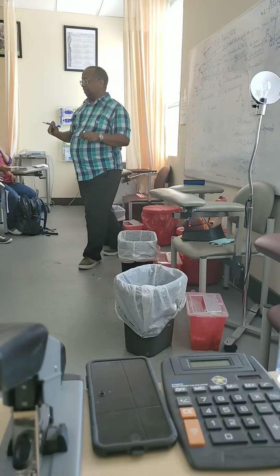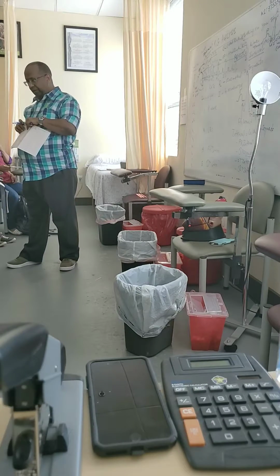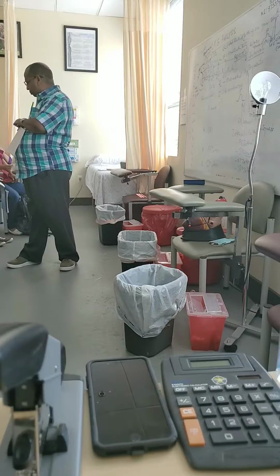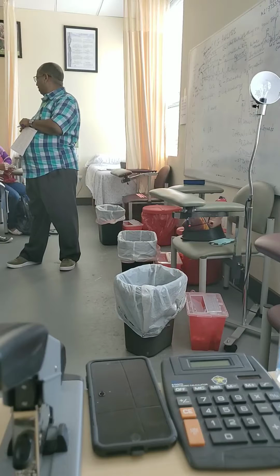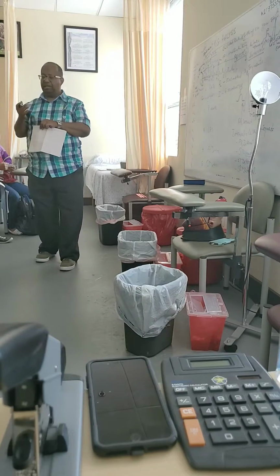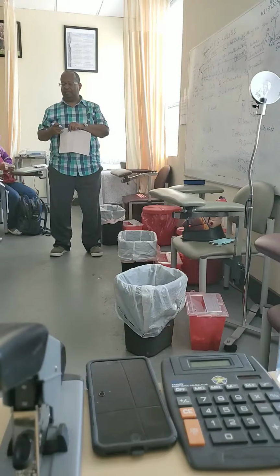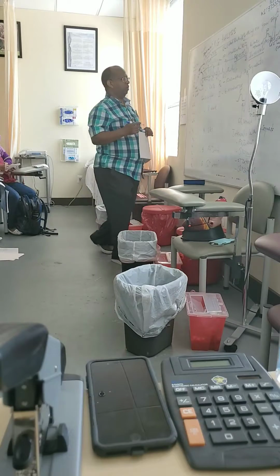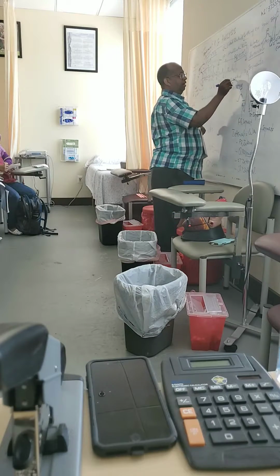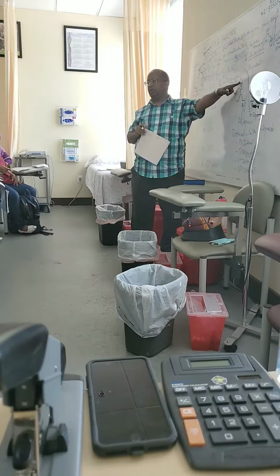You take the R and R. Can you see the little squares between R and R? You count those little squares and divide 1500 by that number. Let's say you got 20 little boxes. 1500 divided by 20 gives you 75, which will be your heart rate.